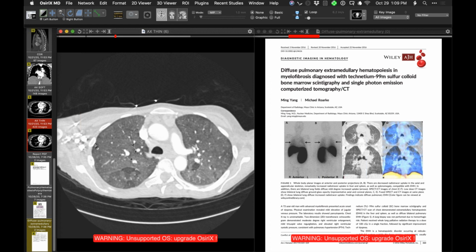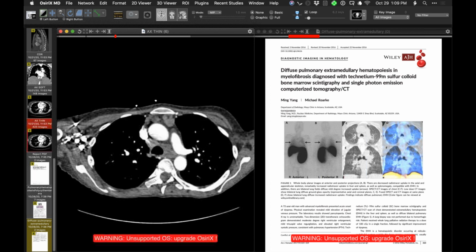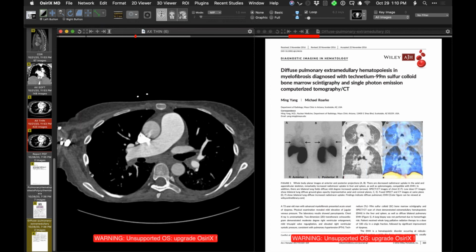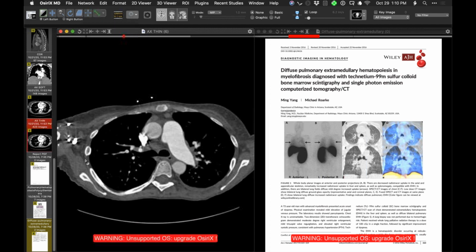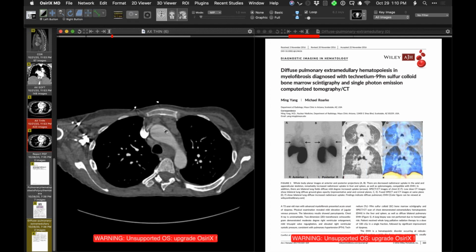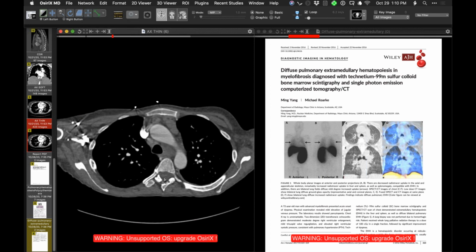Wow. Any paravertebral extramedullary hematopoiesis? Let's have a look. I think so. There's some lymph nodes. And is the pulmonary hypertension thought to be due to just a high output state, or what is it from? I'm not really sure, maybe multifactorial, small vessel disease. I don't really know for sure. Now that you ask about looking for extramedullary hematopoiesis, I would say that if anyone sampled these things, I wouldn't be surprised that there's extramedullary hematopoiesis in those nodes too.